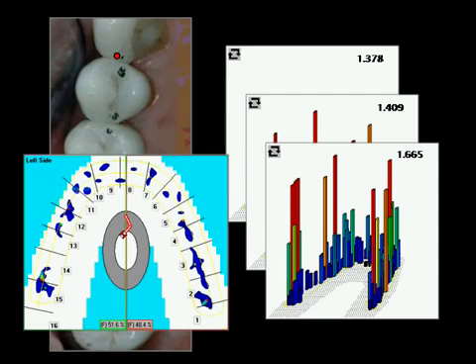And I ask you, how many of you looked at that contact on the distal of number 11 as a source of a problem? But yet, if that contact is high and early, you can imagine that the entry of the mandible into the maxilla, hitting on that cuspid, will break that veneer. That's the issue that we can address because we have precise equilibration techniques.